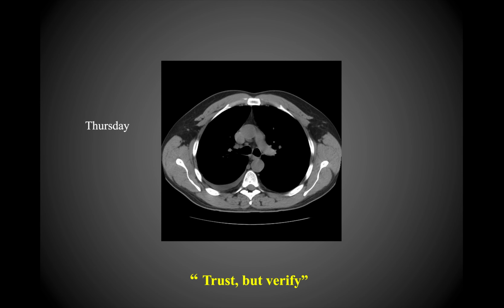And so then finally on Thursday, there was a CT that was done, and so now you can appreciate the pleural effusion that you see here on the right side of the patient in the right lung. So once again, you want to trust but verify. So this is where the impression was verified with CT, since it wasn't being picked up on X-ray.